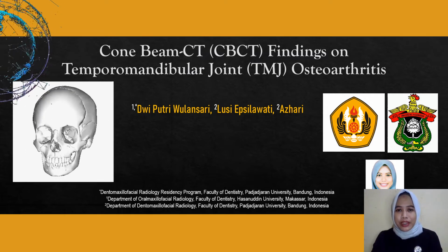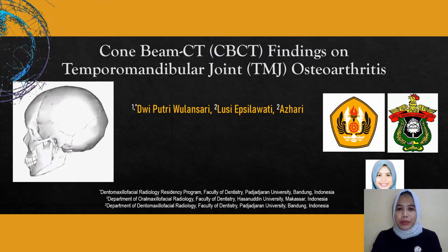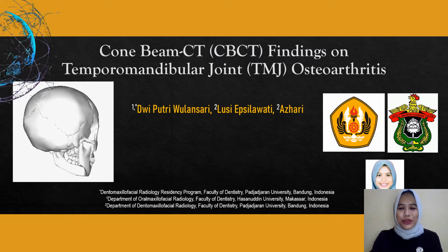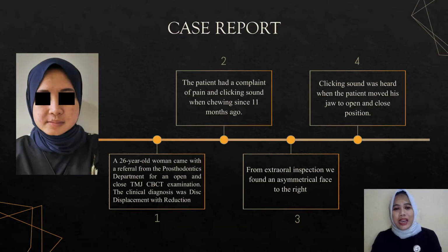In this occasion, I would like to present a case report entitled Cone Beam Computed Tomography Findings on Temporomandibular Joint Osteoarthritis. A 26-year-old woman came with a referral from the prosthodontic department for an open and closed TMJ CBCT examination.